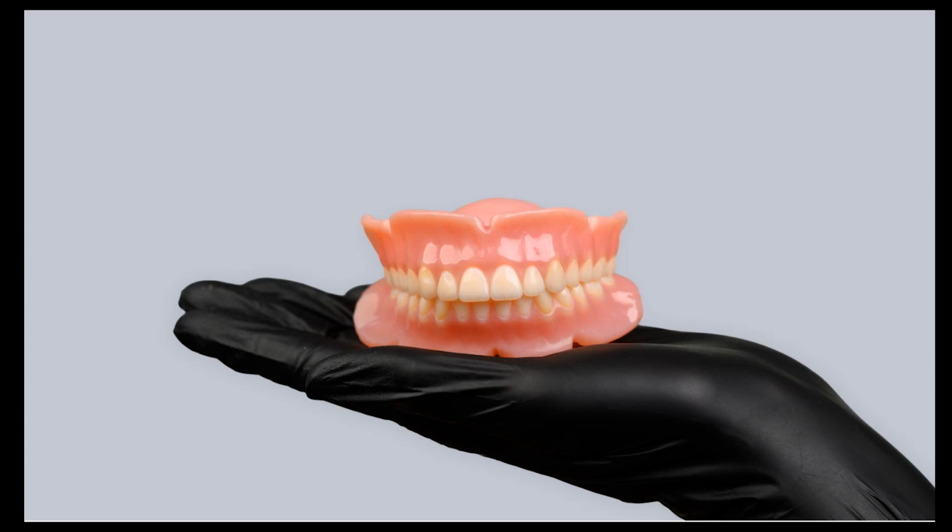Now, the last step I would recommend is triggering the dental view again, just to make sure that everything was done according to your requirements. If you see any teeth that are either green or red, it means they're assigned with basic shades. Any models that have this colorful scheme have True Voxel shades on them.